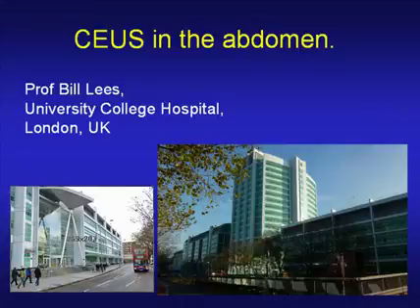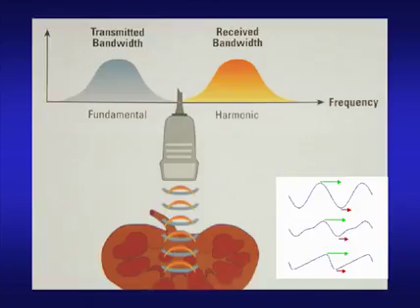Contrast-enhanced ultrasound in the abdomen. One of the things we've discovered in using contrast over the last 15 years is that ultrasound is inherently nonlinear.